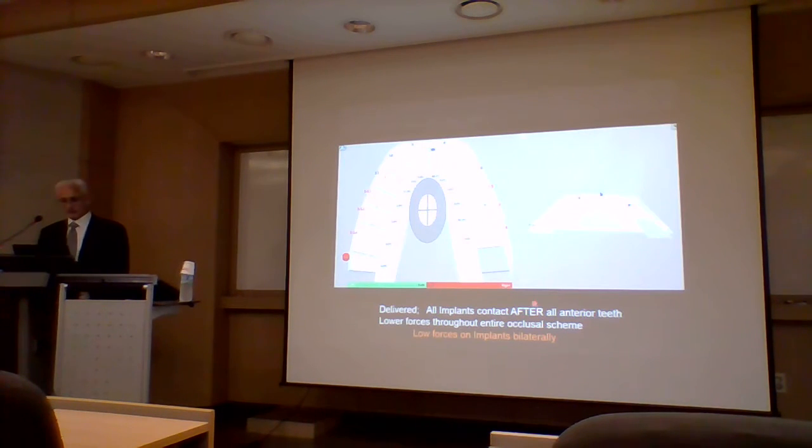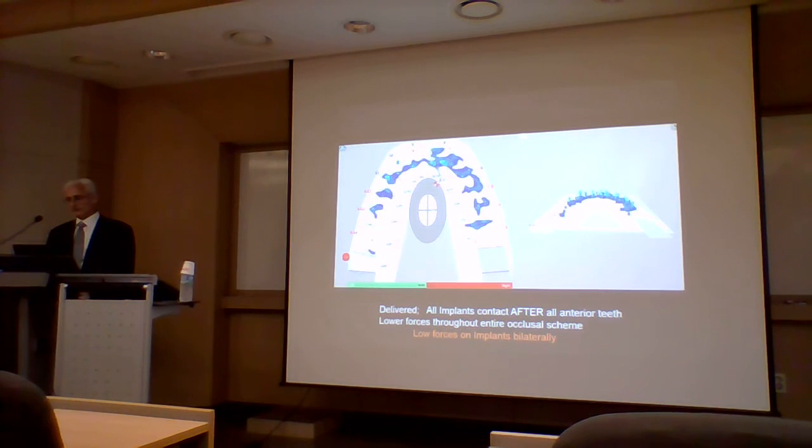So when we get to the end of this sequence, turn this off again, and play this. Now you'll see there's anterior uniformity, and posteriorly the implants maintain a low force and come together later than the anterior teeth. And that's by design.